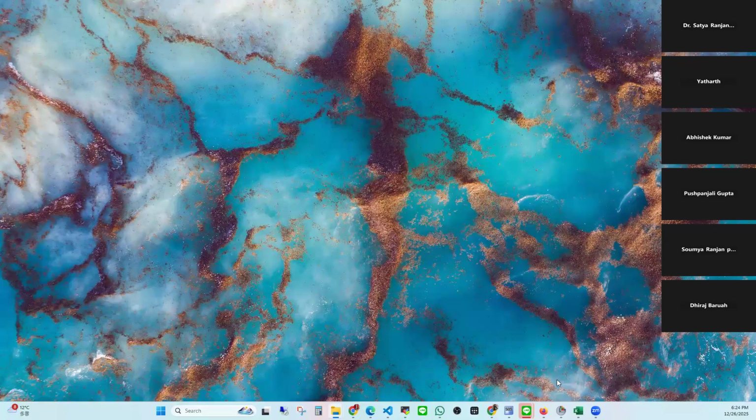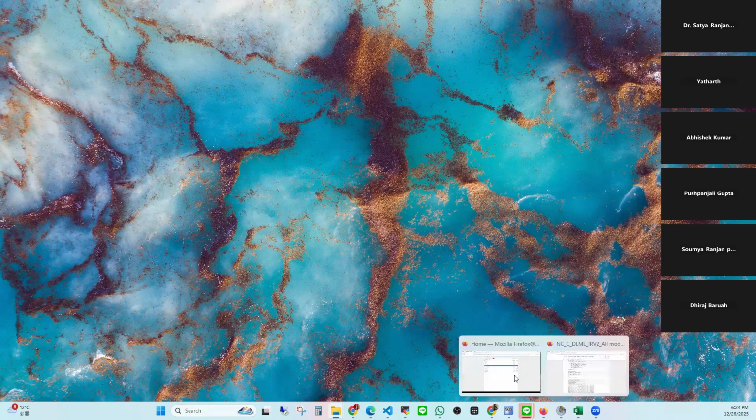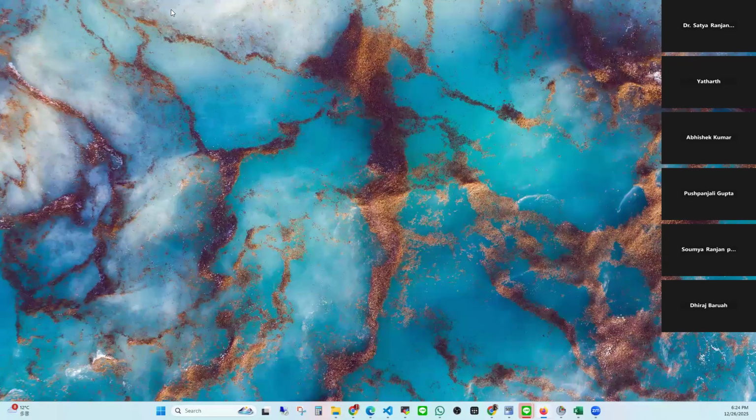Okay, that's good. If you do not have any doubt, I think this much from my side for the 3D radiomics part. Just like I said, we can go for extraction of features and then use different types of explainable AI to see which features are actually useful.